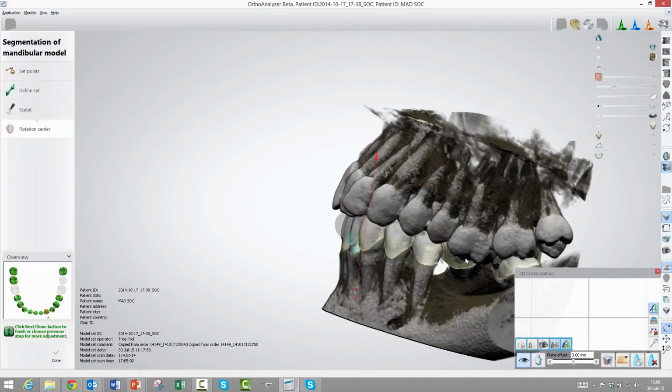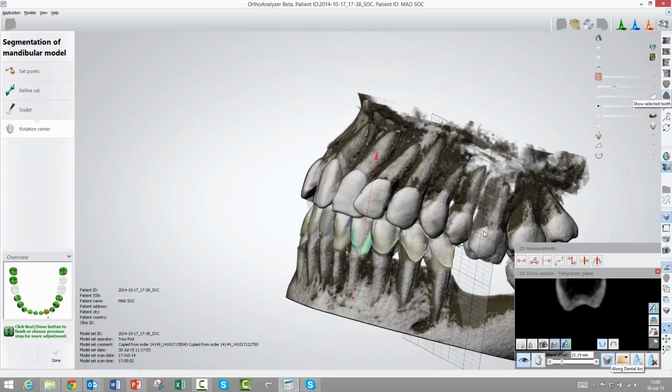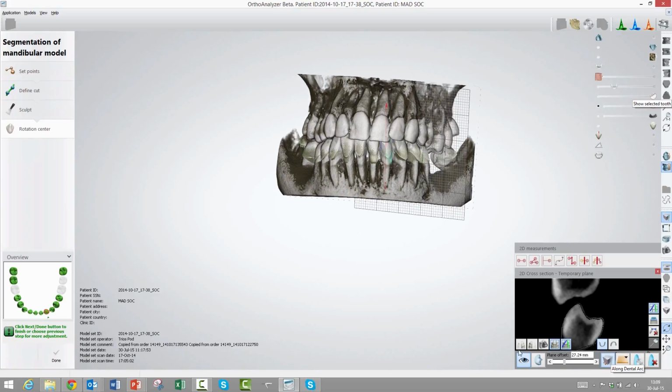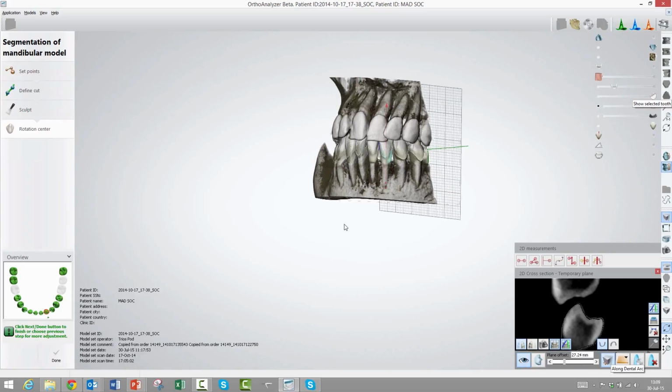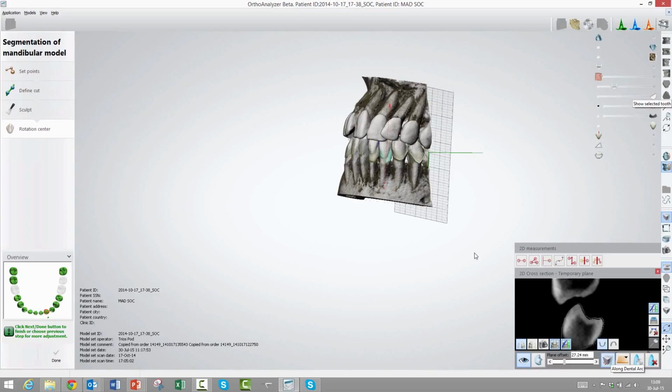And we also have another possibility. Down here we have along the dental arc. And if we activate it, I will just show you from a short view. This arc here will just go around the dental arc instead. So we have a different view. And exactly as before, you can go in and clip it and take a side view of the teeth in that direction. Got you.